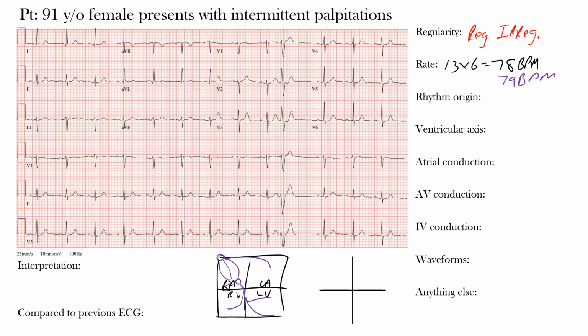So when we talk about sinus rhythm, that means that we're originating from here, the sinoatrial or sinus node. And notice that our conduction pathway heads this way, towards our AV node, which is here. So if we were to superimpose the right atrium on this, imagine this is our right atrium here that we're putting on this vector, with our sinus node sitting up in this area and the vector heading in this direction, you would see that the normal P wave axis, which represents the atrial depolarization, is between 0 degrees and about here, positive 75 degrees.